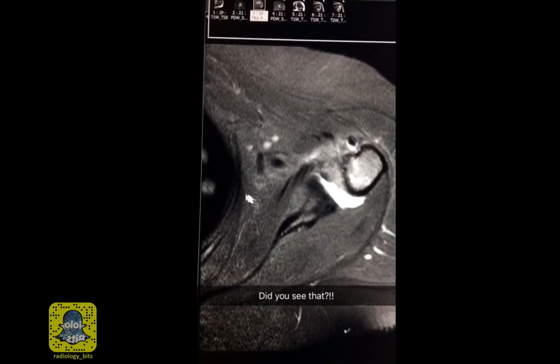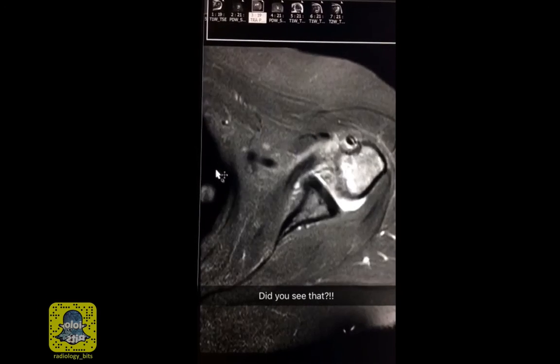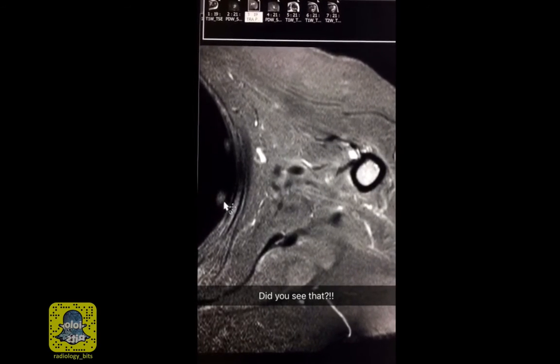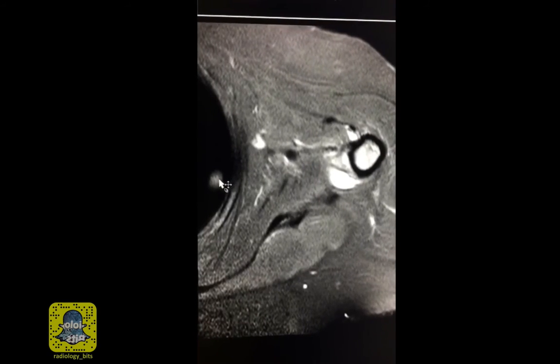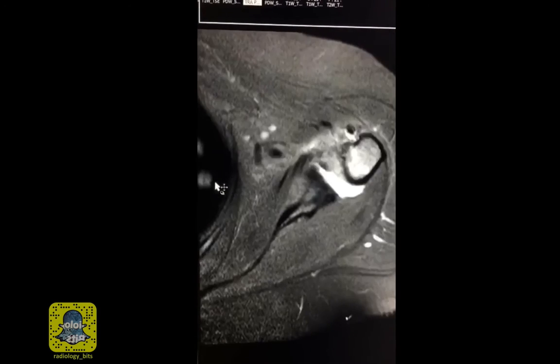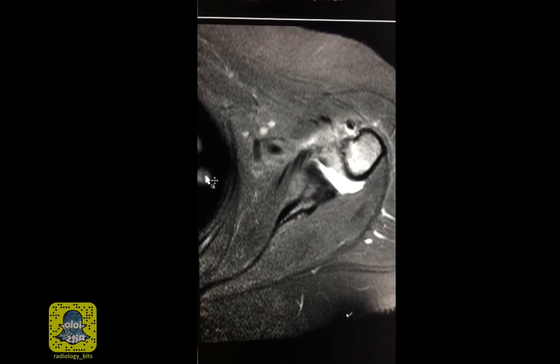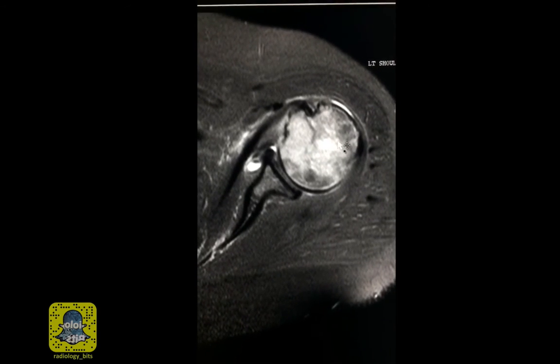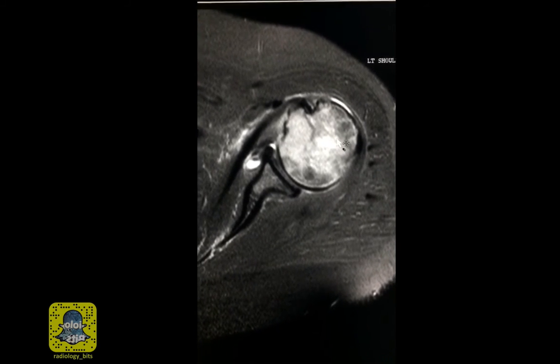Speaking of which, have you noticed those? And this shows you multiple lung nodules at the edge of the film. Now that you see those, you're really thinking about metastasis. And the lesion involving the proximal humerus could be metastatic as well.